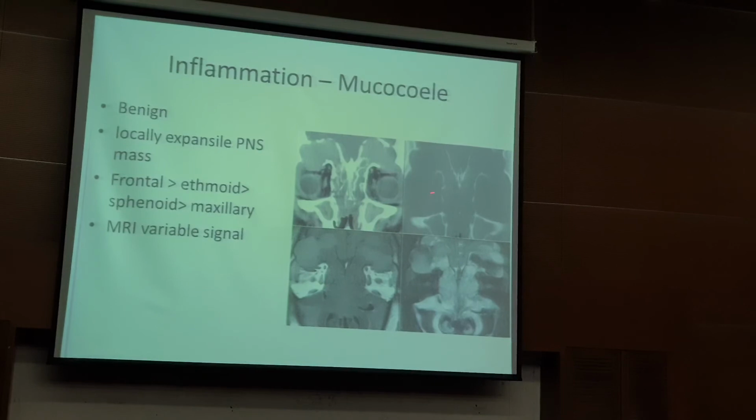Why is this not tumor? It's because you can see bony septations. The bony septations are still preserved. A tumor would usually eat and destroy bone. Polyposis wouldn't do that. You can still barely see some septations within the ethmoid sinus.